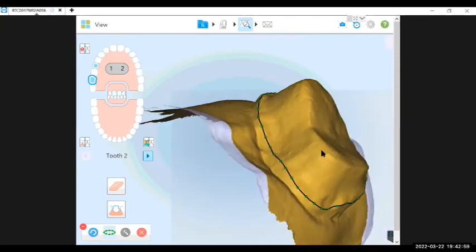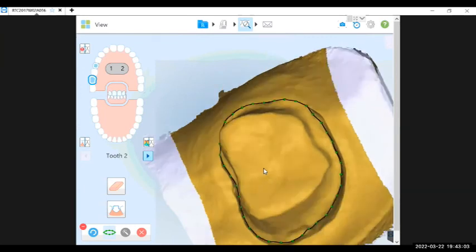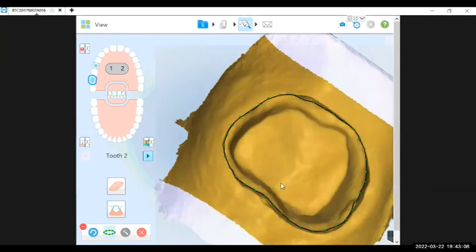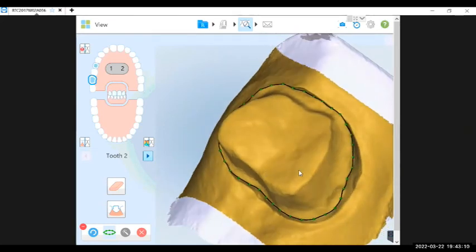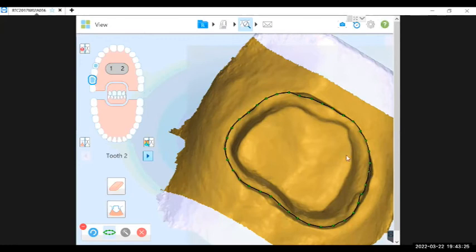Looking at this 360 degrees around, sometimes it is not perfect. We do have the ability to move dots, and you can move them anywhere you want. And you kind of have to be careful with what view. So if I'm doing it from this view and I mark this one, I can turn it.